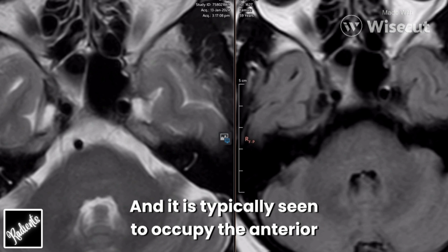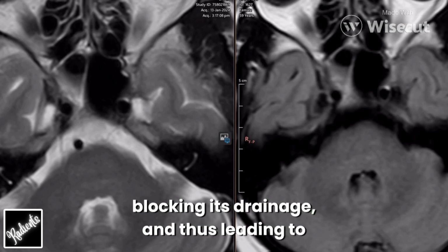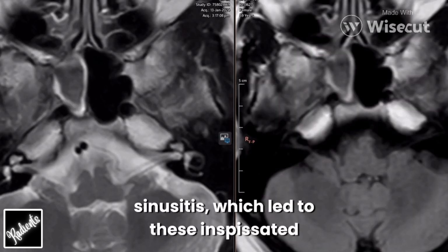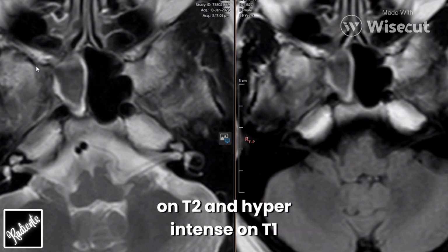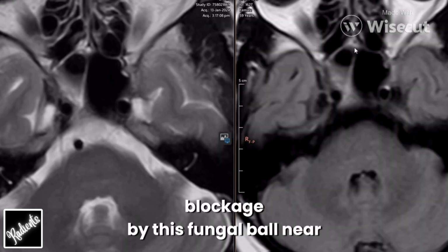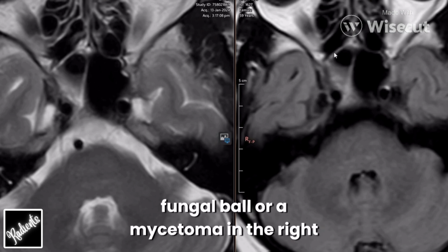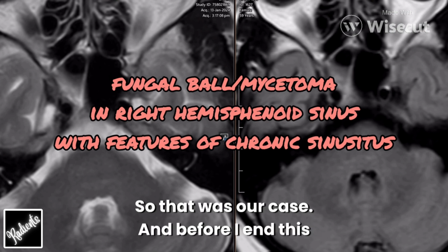it is typically seen to occupy the anterior part, very often near the ostium, blocking its drainage and thus leading to these features of chronic sinusitis, which led to these inspissated secretions, which are typically hypointense on T2 and hyperintense on T1 weighted images. So there is chronic sinusitis here as well, but that is secondary to blockage by this fungal ball near the ostium. So that is our case, a fungal ball or a mycetoma in the right hemisphenoid sinus with secondary chronic sinusitis related changes. So that was our case.